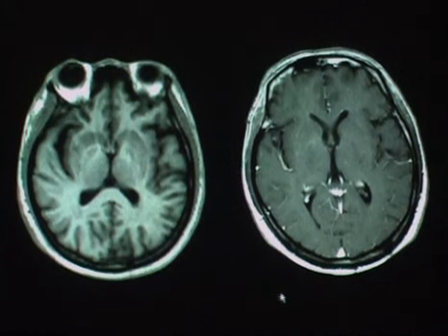So here's a case of an elderly gentleman who became progressively demented. The question was, is this going to be something like multi-infarct dementia? Is it going to be Alzheimer's? It's fairly difficult to detect much in the way of abnormality here on the pre-contrast T1 weighted imaging. Perhaps some increase in hypointensity associated with the corpus striatum bilaterally. Maybe some vague enhancement here on the post-contrast, but nothing clear.